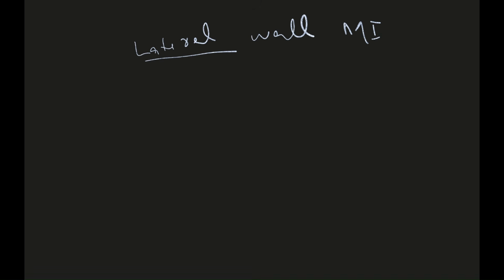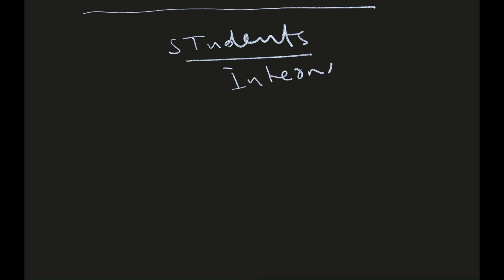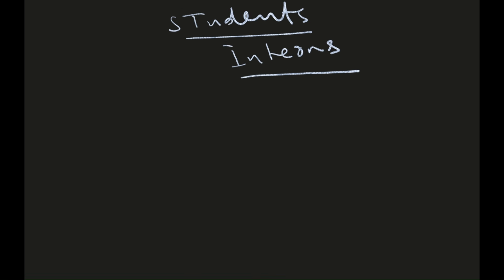So this concludes our basics of ECG. Now this portion is for students and interns. These few points will be very important for them and they will be asked in exams as well. So in OSPEs and OSCEs, usually a teacher expects you to tell them if any of these things are not good in the ECG. So let's just start with the first thing.